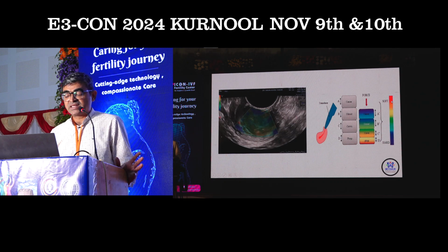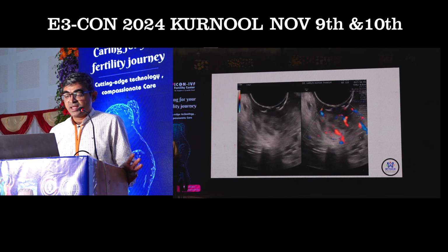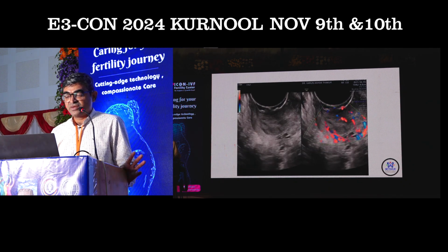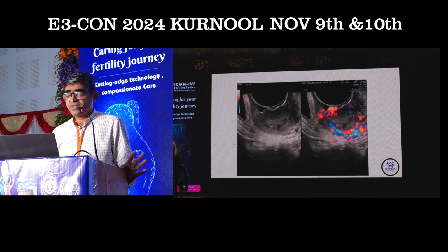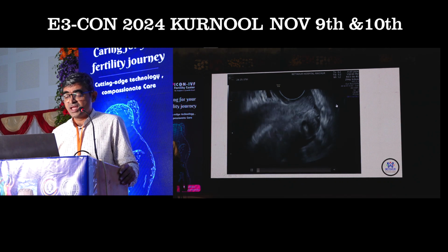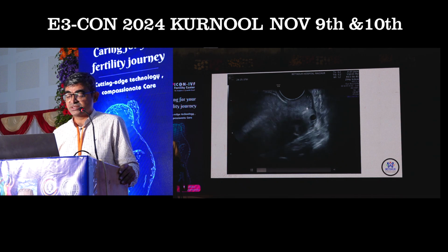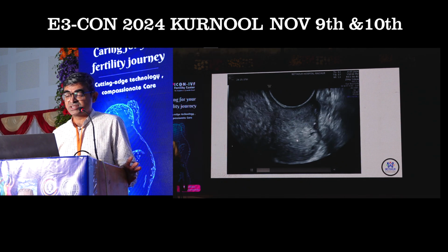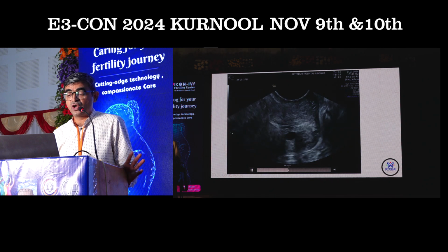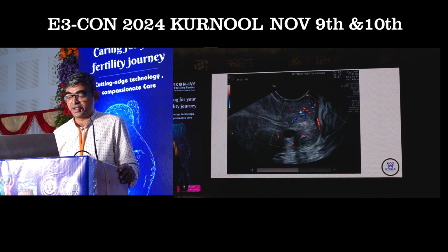Again, in cases of cervical lesions, some lesions may not need imaging, because for CA cervix we depend most often on clinical examination only. Yet another case: this patient presented with pain abdomen and a simple white discharge. I am able to see the cervix looks hypertrophied with a few nabothian follicles, and I always say that we should put color. She had features of cervicitis on clinical examination. So cervicitis is actually a clinical diagnosis. Sometimes you get a lot of vascularity without losing the pattern architecture of the vasculature. For example, in the first slide which I showed, usually the normal cervix will not take much vascularity.